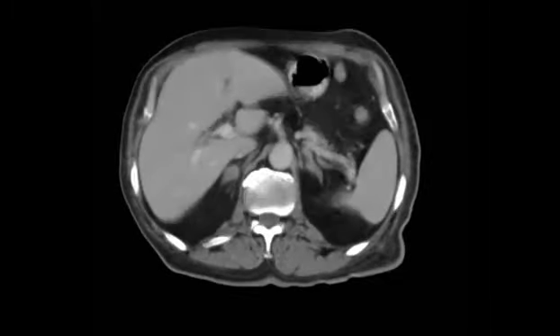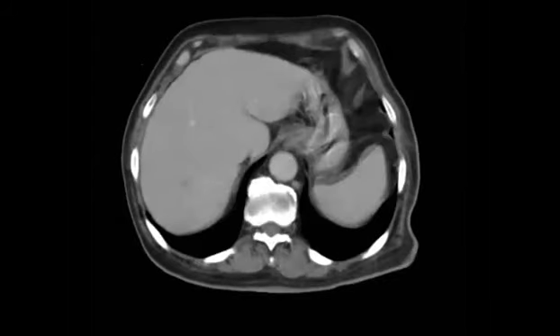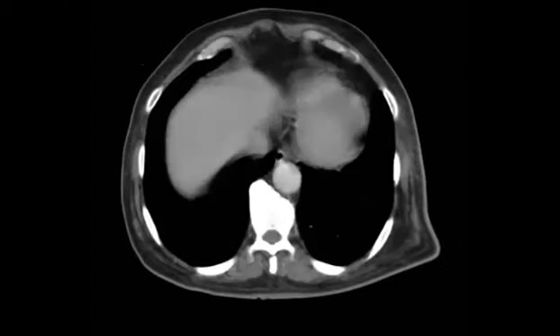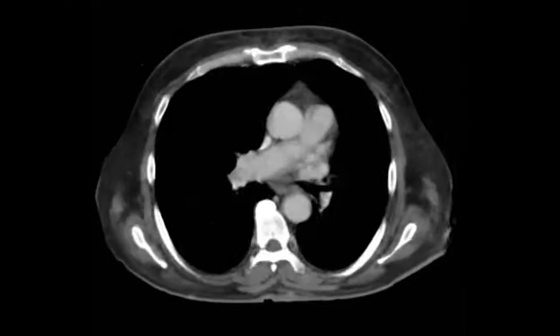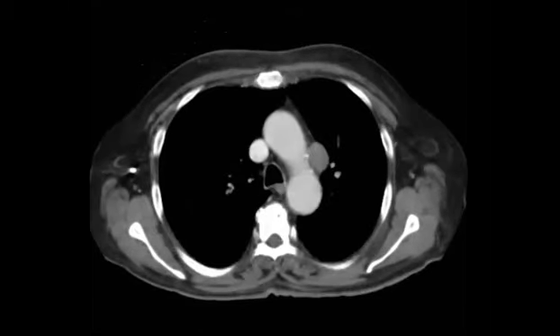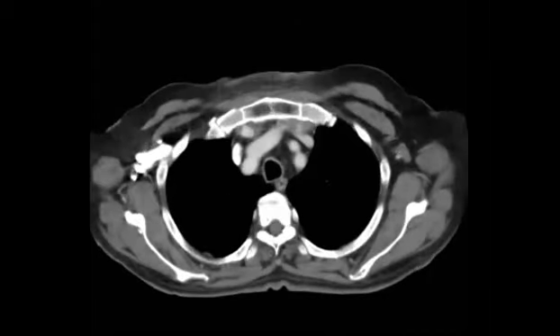So this case came to me, the patient's age was about below 60. And I want to collect the findings from you. Write in chat, and when you are sure, then just press enter. Then I can collect for everyone how many stars he is going to get.